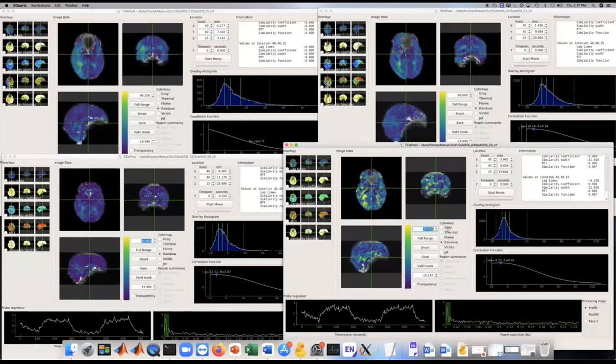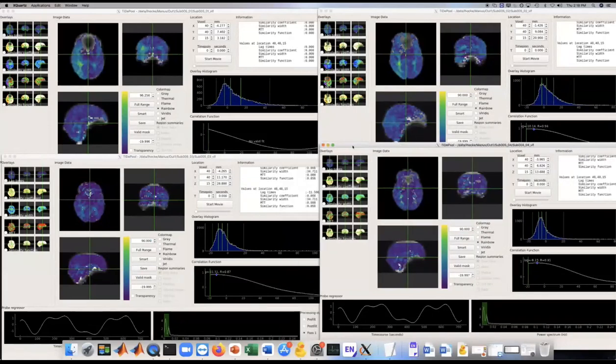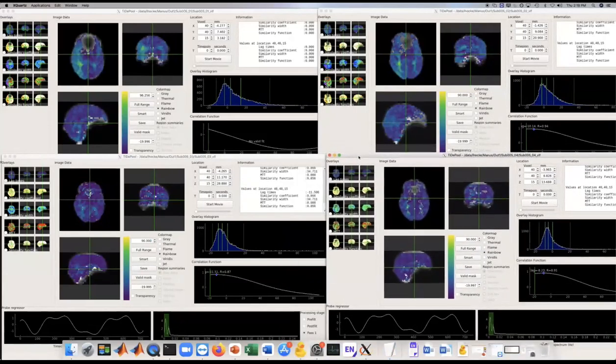So that is reflecting that there is less of the long delayed blood flow in this area. You can also look at the distribution again. It's hard to compare them visually here, but you see a little bit in scan 3 and 4 that the distribution becomes much peakier or narrower. So more delays are very close to 0 with a narrow range of delays. And that's exactly what we expect from recovery.